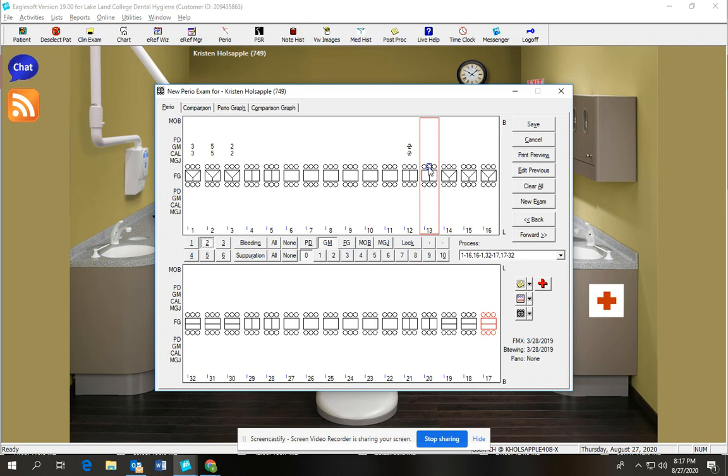So if they're taking this medicine, you would take your probe depth, kind of feel where the CEJ would be, and then click negative, let's say 5. -4. So over here, this is an example of if the gums are inflamed. And then over here, this is an example of if when you look in the mouth, you see recession.